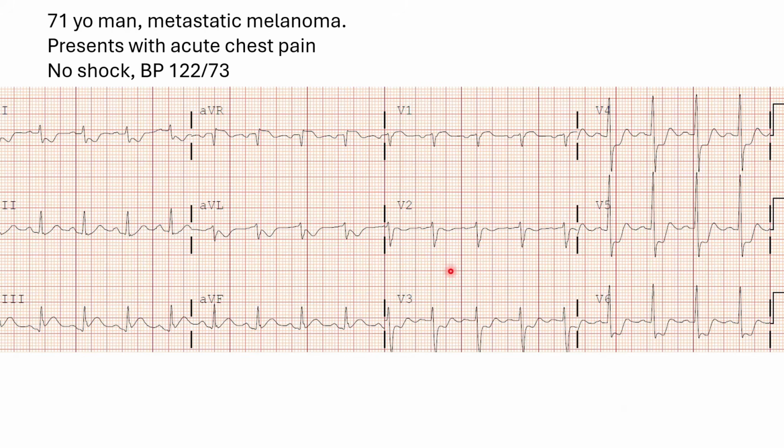This is not primary RCA STEMI. You need to take this patient to the lab, preferably urgently. And if this patient is having active massive pulmonary edema, you have the time probably to stabilize him, diurese him before rushing him to the lab and decompensating his heart failure furthermore. Try to stabilize him if he's not stable yet.